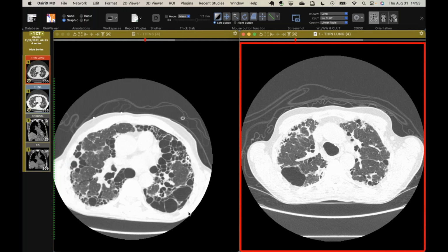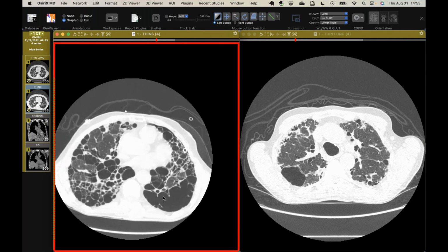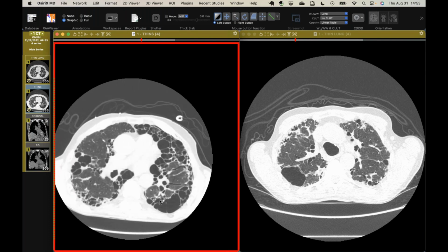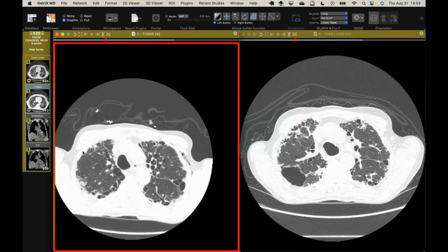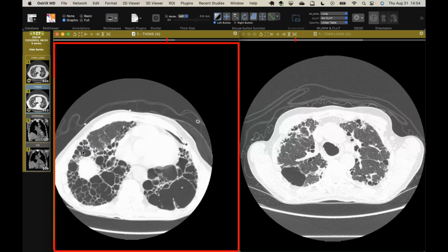Sometimes we've seen those patients with a smoking-related ILD get this kind of phenomenon, usually in the posterior lower lobes, this so-called airspace expansion with fibrosis. Yeah, and I wonder if indeed this is what this is. Because if you look elsewhere in this patient, it's a denser fibrosis, but it's not the typical UIP reticulation type fibrosis that you typically associate with rheumatoid arthritis. I think it's a different pattern.